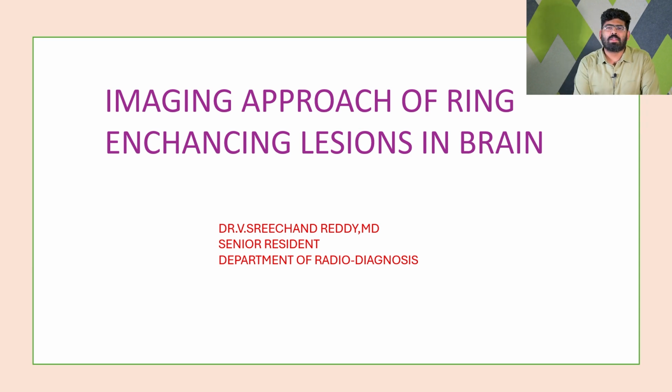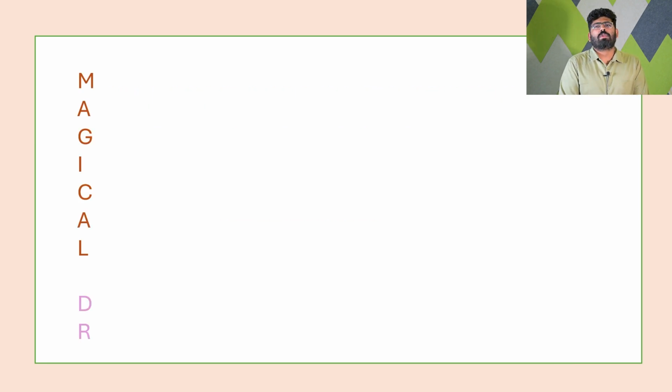For ages, it has been difficult to differentiate a few of these lesions from one another, and they sometimes overlap. So I want to simplify it for you. Coming to ring enhancing lesions, this is the mnemonic widely used around the world.